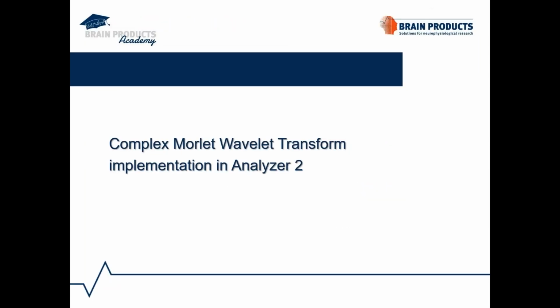Now it is time to move to the demo part. The purpose of the demo is to show you how to compute evoked and induced power using wavelet transformations in Analyzer 2.